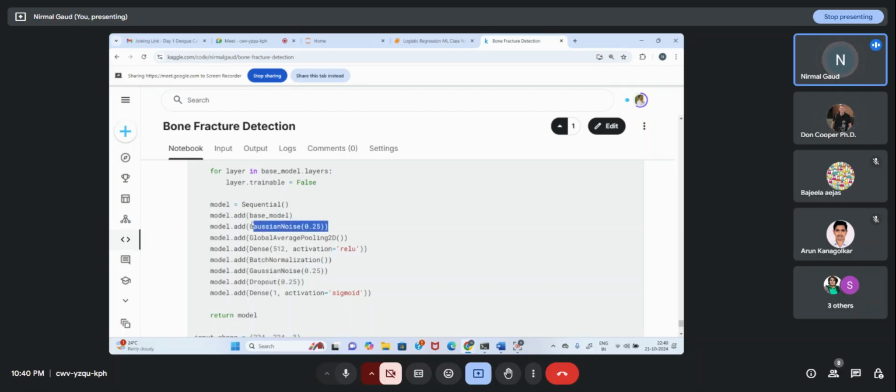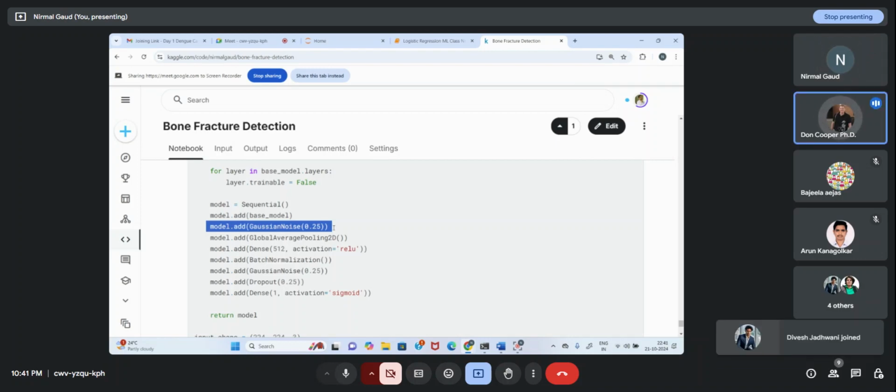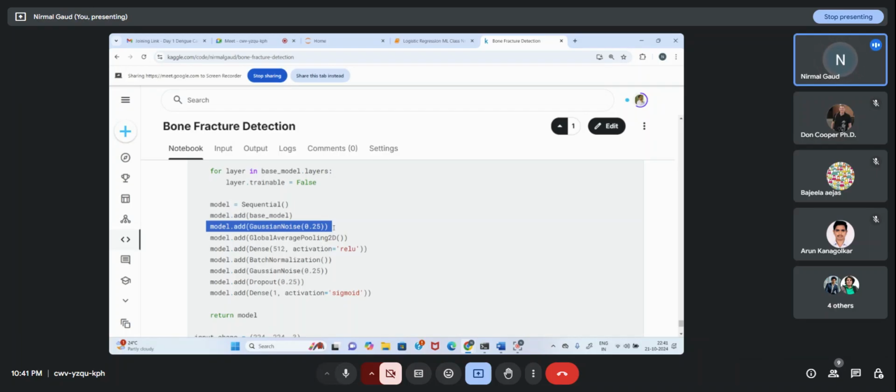Okay, just remove the noise and then see if there is any improvement. So we'll check whether the noise is helping or not. Suppose there'll be a point where you might get some improvement, but then it'll start to get worse. Yes, sir, definitely. That's a good suggestion. We'll get some suggestion related to whether this noise typically helped or not, or whether the architecture of Xception itself is doing the task.